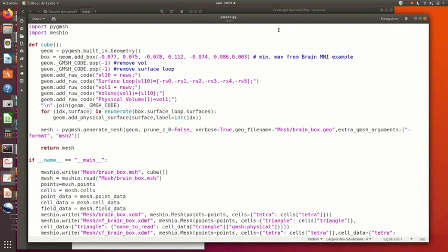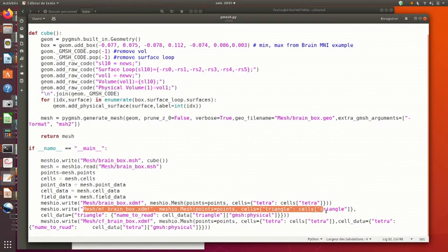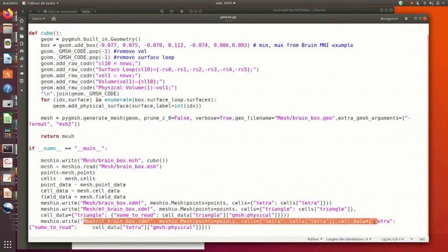Here we have the maximum and minimum of each dimension retrieved from the NIfTI files. Here is the length you choose, 3 mm here. And with the Meshio library, we construct the mesh. Here the edges, and here the cells. Thank you to Davide Baroli for this one.